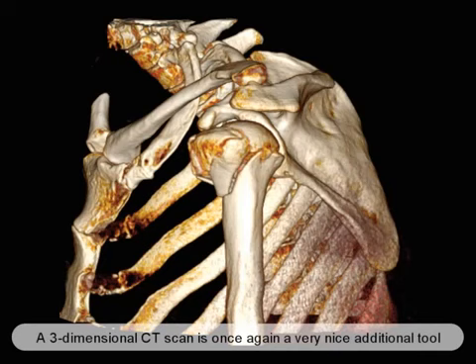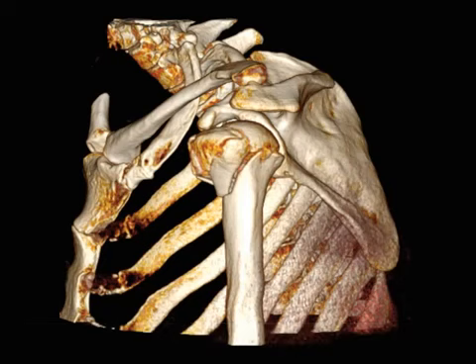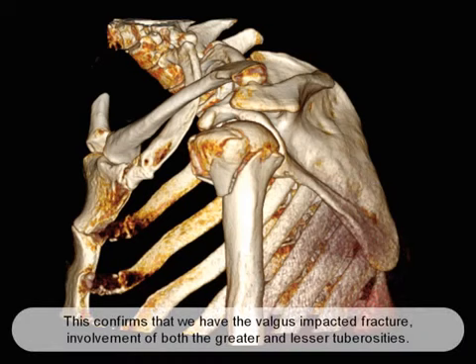A three-dimensional CT scan, once again, a very nice additional tool to confirm that our diagnoses are correct. These can be taken in multiple planes, and you can very nicely rotate them around to see it in multiple planes. And this confirms that we have the valgus impacted fracture, involvement of both the greater and lesser tuberosities.